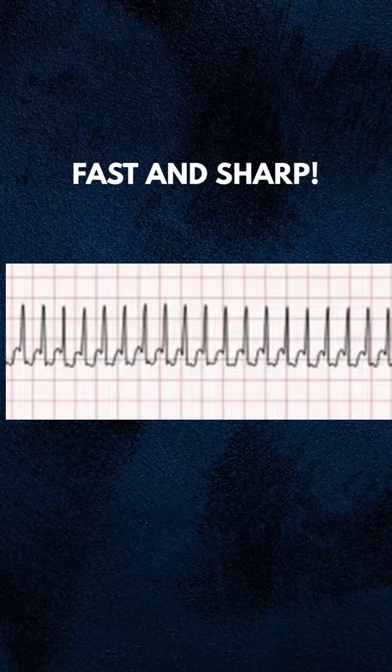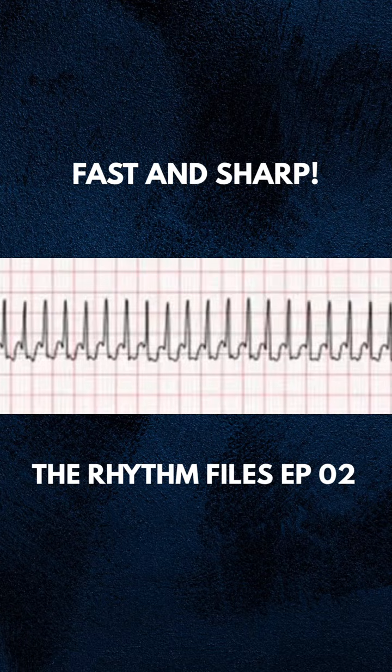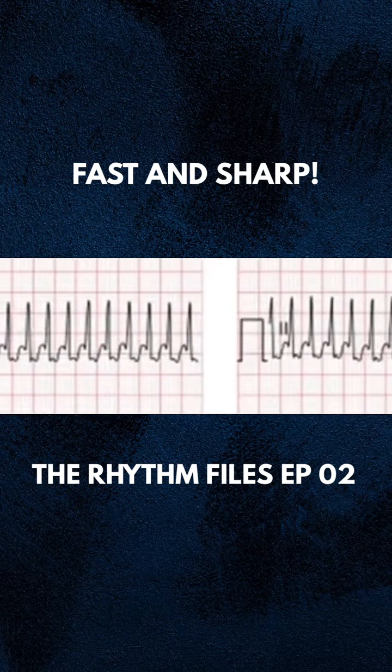This ECG is fast and sharp. And no, it is not sinus tachycardia. Hello everyone, welcome to the Rhythm Files episode 2. Let's have a look at this case.